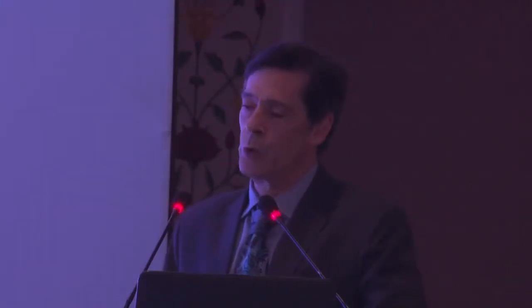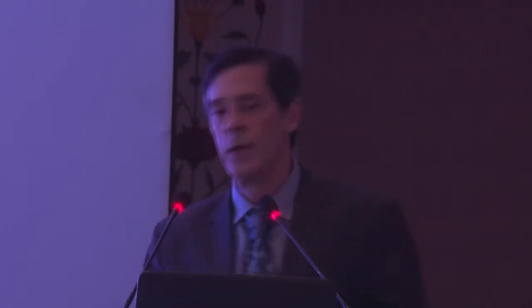These were data from the Visual 1 study, which was a collaboration between Duke and AbbVie, and it included a correlation of visual acuity with cystoid macular edema and DRIL. And you see, again, these findings of the intact layers on your left. In the center panel, you see the discontinuity corresponding to a region of DRIL, and then on the right, you see this was reestablished at the fovea.